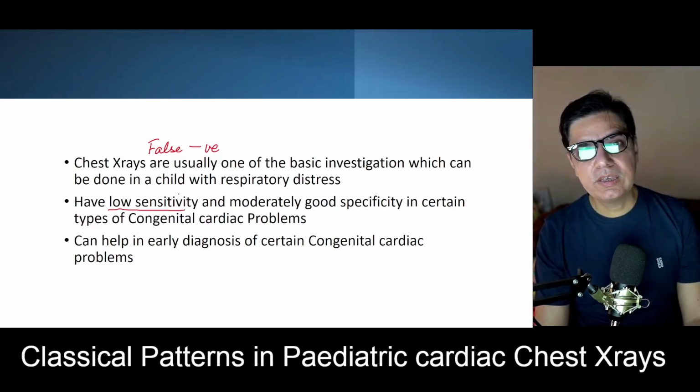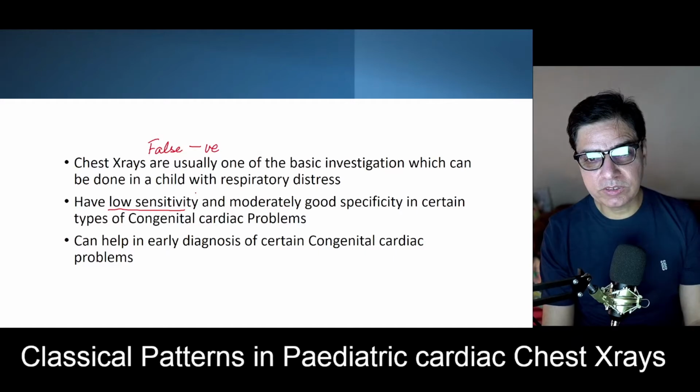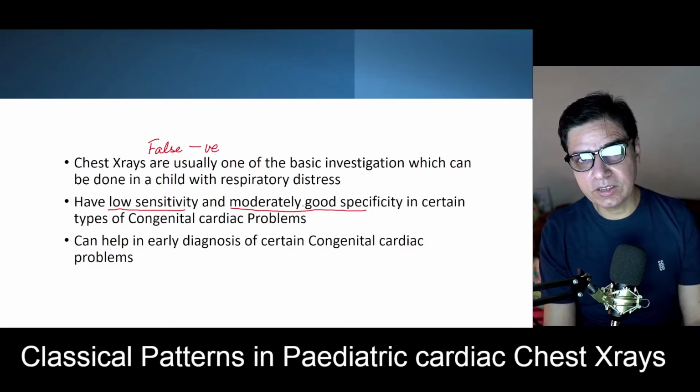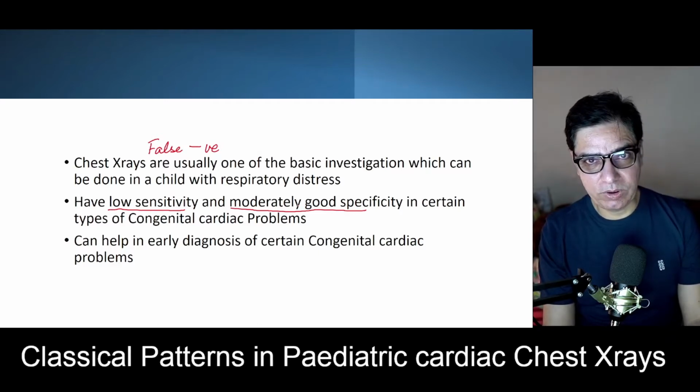But if it is positive, then the chances are high that the child has that particular cardiac disease if you come across particular signs on the chest X-ray. In other words, it has moderately good specificity. So if you get something, then chances are very high that the child has an underlying cardiac problem. To put it in simple words, a chest X-ray can be a very good initial test if you are suspecting cardiac problems.